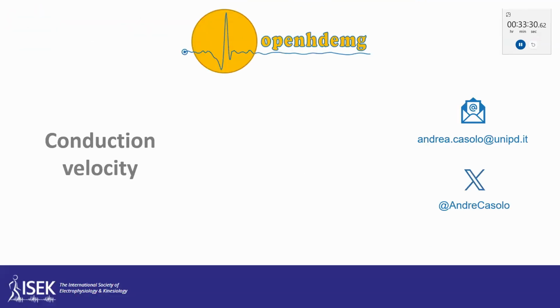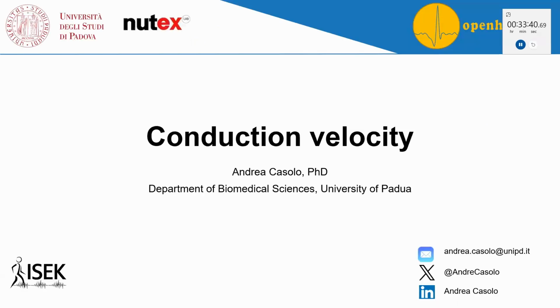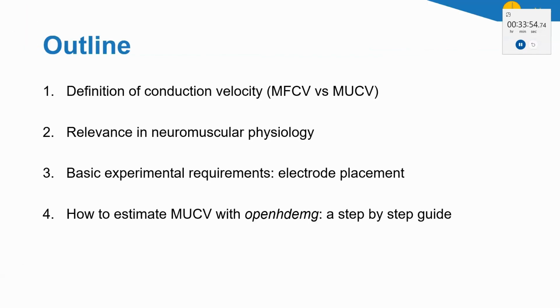Okay, thank you everyone for being here today, and thank you Paul and Giacomo for having involved me in this open source project since the beginning. In the next 20 minutes, I will show you how we can estimate non-invasively conduction velocity through openhdemg.